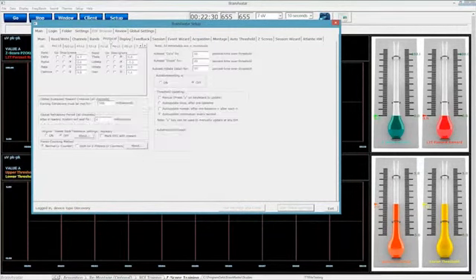In the original software, and still in our software, you have control of the global sustained reward criterion for all channels as well as the refractory period. What the sustained reward criterion means is that this training, whatever you have set up, must be met for this many milliseconds in order for your feedback to be successful.